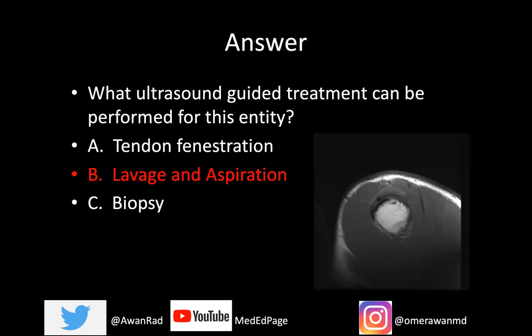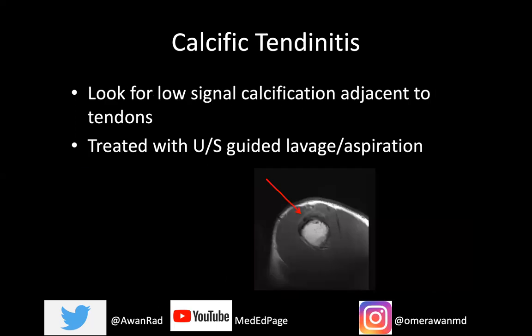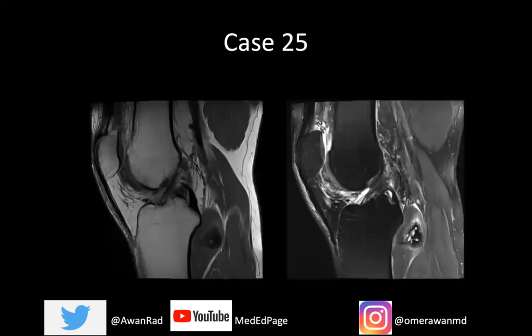So remember, I showed you the X-ray appearance of calcific tendonitis. I want to show you now the MR appearance for calcific tendonitis as well, right? It's going to be very low on both T1 and T2.